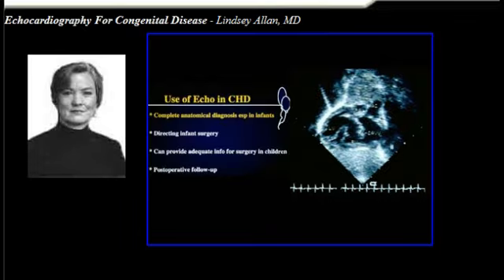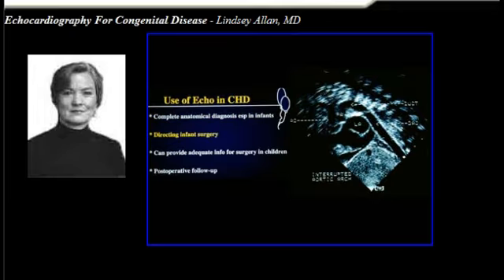And this can help you to direct you towards the surgery. And here's an example where this echocardiogram is sufficient for the surgeon to be able to plan the surgery and understand the anatomy, sufficient for proceeding to the operating room without any further information.